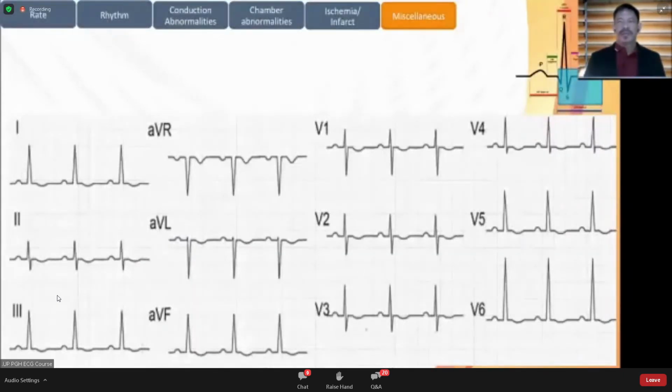We have gone through recognizing the more common ECG abnormalities up to ischemia and infarction. As a reminder, presence of STT deviation does not always mean there is infarct or ischemia. It is important to remember the criteria. If the STT alterations do not fulfill them, the term non-specific STT wave changes is usually applied. This brings us to the last part by looking at some common miscellaneous findings.